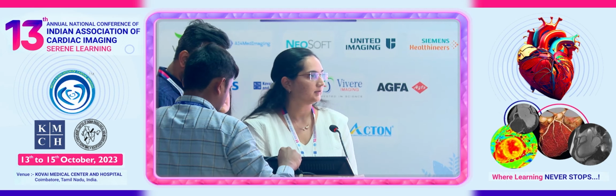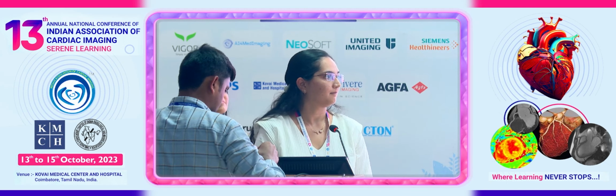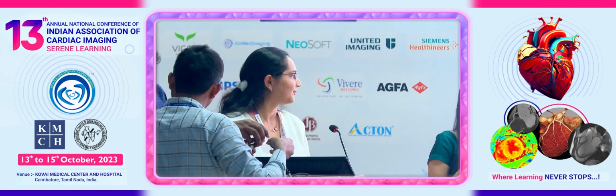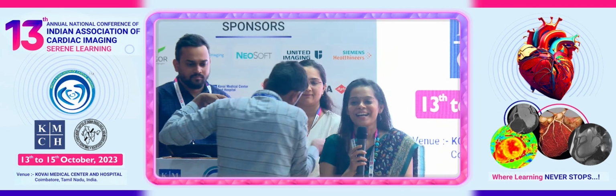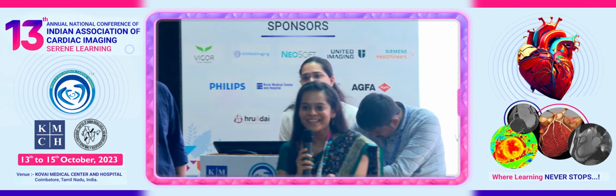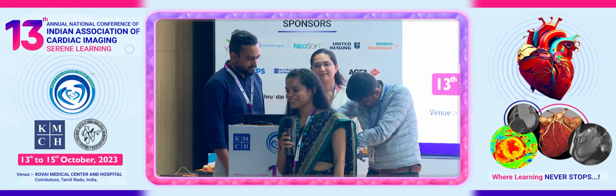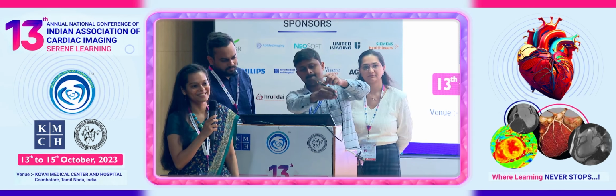But what is very interesting here is the extension of the aneurysm into the cavity of the right ventricle. Has anyone seen a case like this? Actually, did anyone guess that it was an aneurysm? Because if you just look at the MR, it looks like an intracardiac mass. Maybe because the inferior wall was scarred, the burrowing into the myocardium was possible. That was the problem.